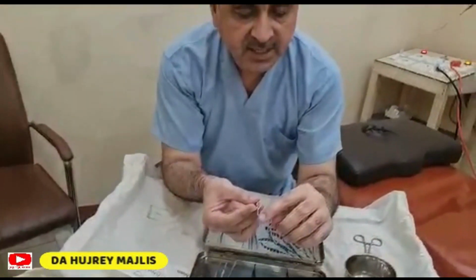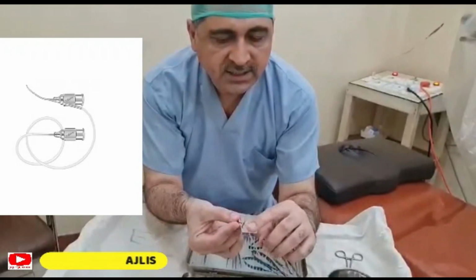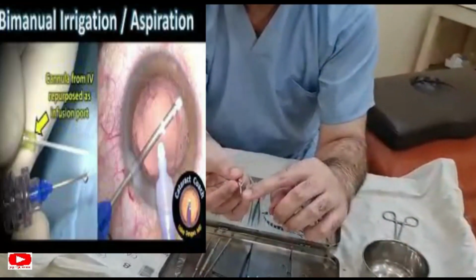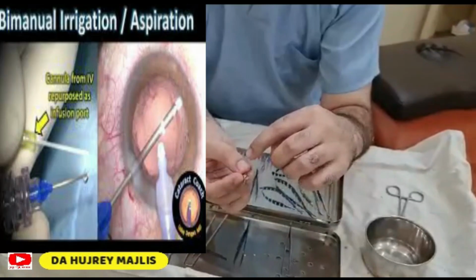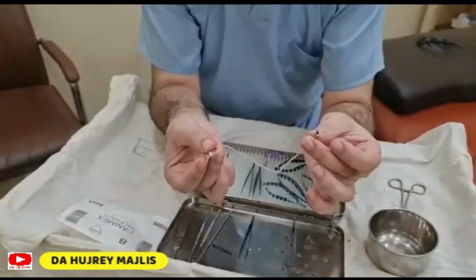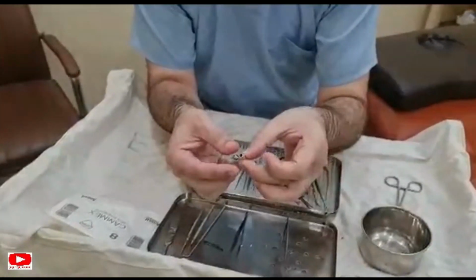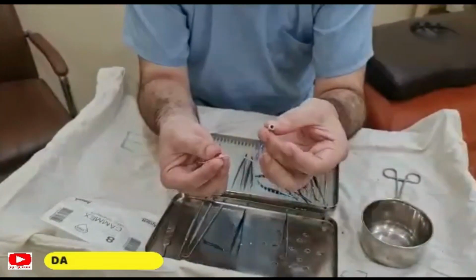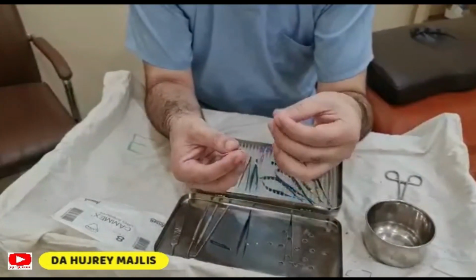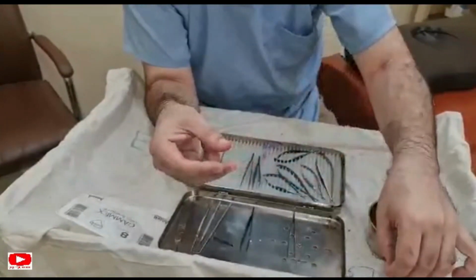We have an aspiration hole at the tip of this cannula, on the outer or interior surface, which prevents rupture of the posterior capsule. By this hole we can aspirate, and with the side the fluid goes into the anterior chamber. So the Simcoe cannula is used especially in cataract surgery to aspirate lens matter, viscoelastic, even the hyphema or other extra anterior chamber material.